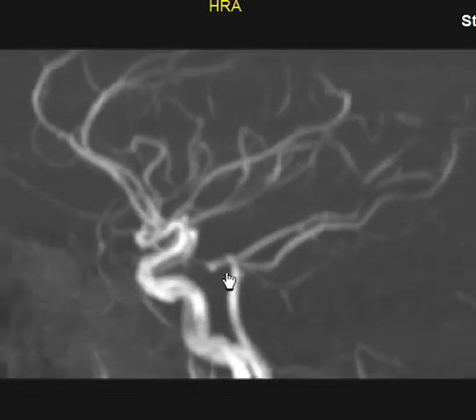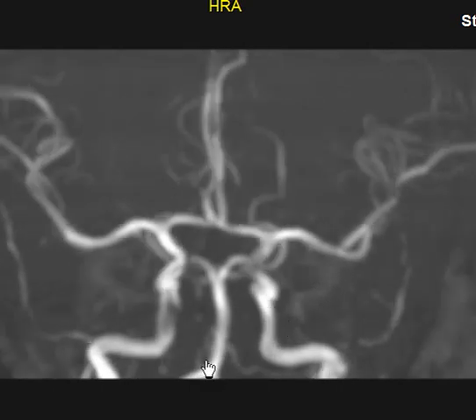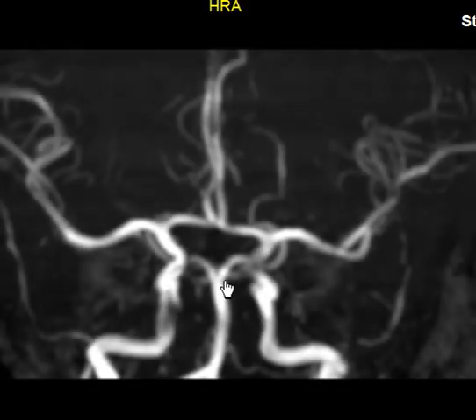This is the basilar artery that will divide at the top into two posterior cerebral arteries. So we have anterior cerebral, middle cerebral, and posterior cerebral. Before it divides, it sends this branch. Do you see it? This tiny branch here and here. So you have the basilar artery sending this branch, and then dividing into the posterior cerebral artery. What's this branch?